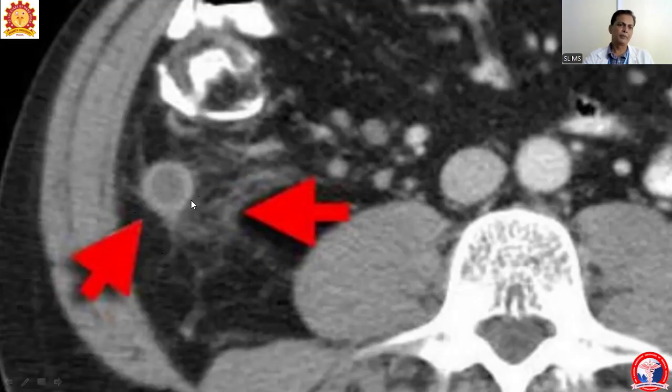Here the periappendicular region is completely normal, with uniform peritoneal fat. Here the signal is altered and appears hyperdense or isodense, showing fat stranding. This is a case of inflamed appendix, or appendicitis.